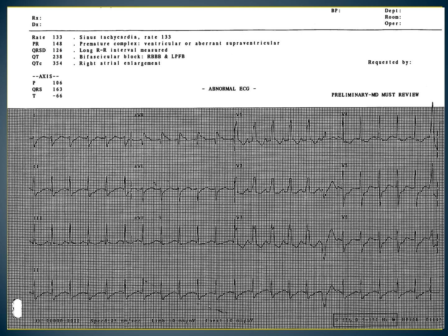Based on the fact that you have a right bundle branch block and a posterior hemiblock of the left ventricle, is this considered a bifascicular block? If you said yes, you're correct. And if you paid attention to the top, you'll see it gives you this information. But don't forget the 12 lead isn't always accurate in the cases of heart blocks and wide complex tachycardias.